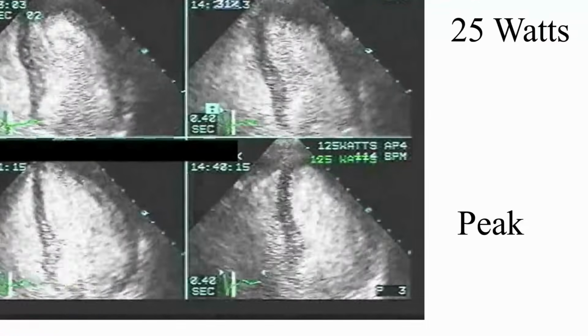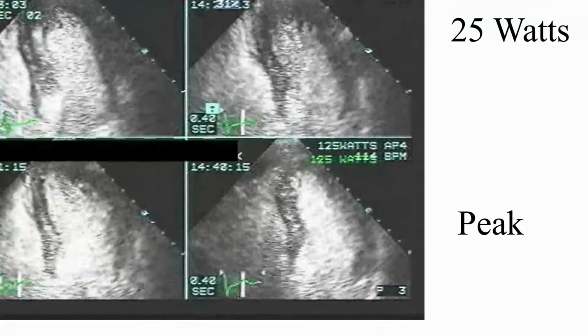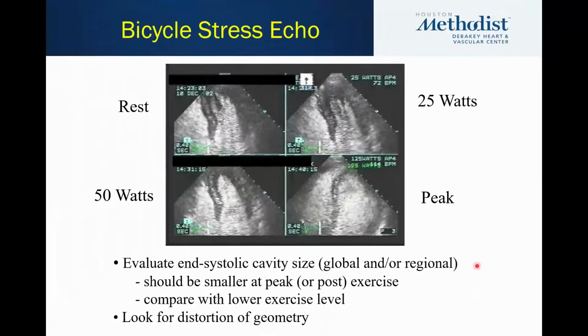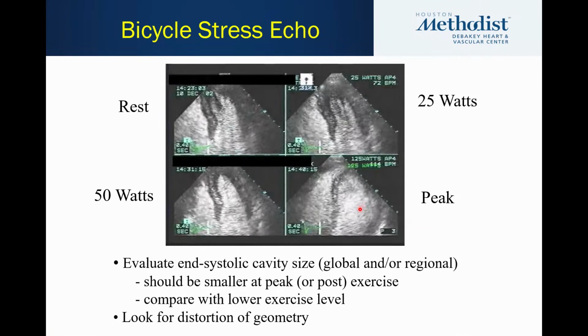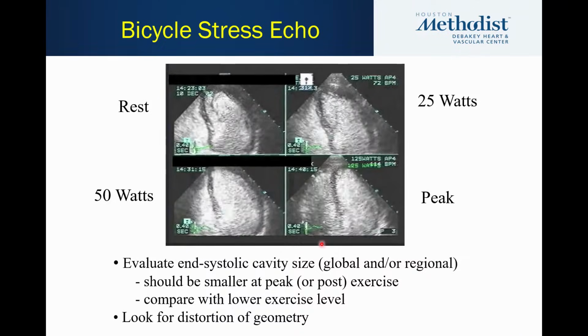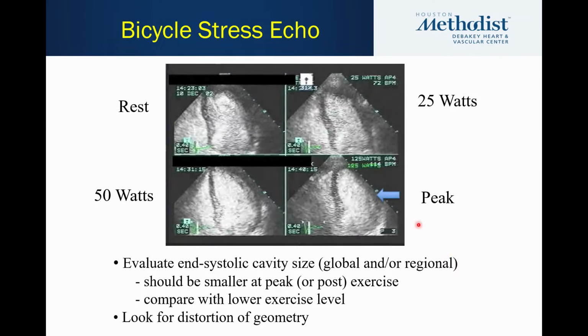Clearly, this is bigger. Okay. Can I see the pointer, Doctor? Oh, I lost the pointer. Interestingly, when we switch, I lost the pointer. Okay, so I have to go back to the other one. Okay, so see this area here, compared to now. And of course, I think my next one is just to put the arrow.